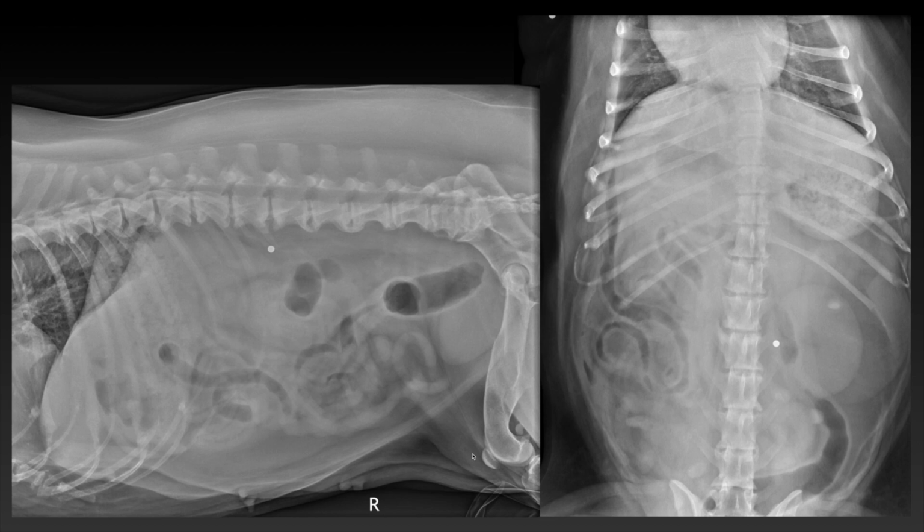The mild splenomegaly is unspecific. It could be caused by congestion, storage, extramedullary hematopoiesis, and less likely as splenitis or diffuse neoplasia. In case ultrasound is performed, the spleen should also be evaluated to exclude possible parenchyma changes.